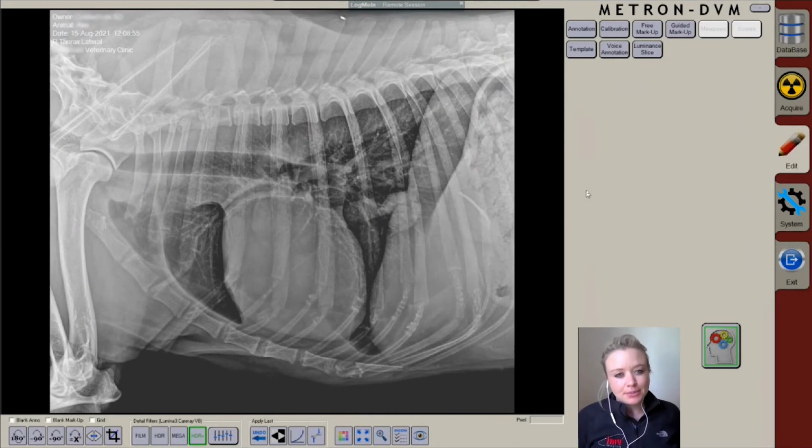To access your veterinary specific measurements, such as VHS, Norberg angle, and tibial plateau angles, you need to have your exposure correctly labeled. For example, for VHS, you need that projection to reflect right thorax lateral.